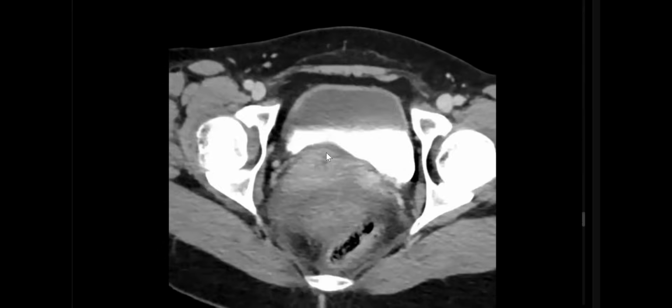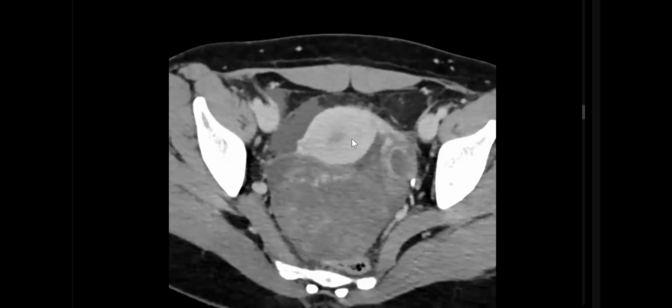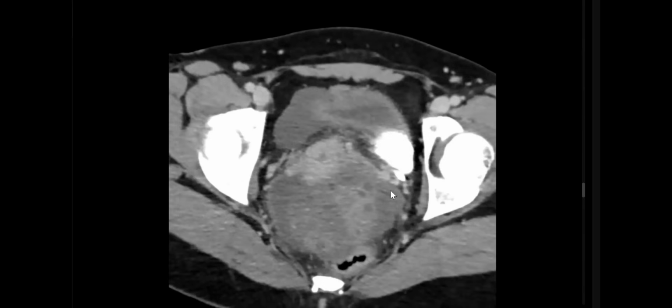Okay, the uterus is not so much enlarged. However, I will still be concerned about ectopic pregnancy, ovarian torsion. Any history, any laboratory data you want? Yes, beta HCG level. Negative. Any history of amenorrhea? Also negative. Normal menstruation 2 weeks ago. Any previous scan showing left ovarian cyst with torsion and hemorrhage, bleeding into the pelvis? So you are suspecting left ovarian torsion. Yes, with bleeding.